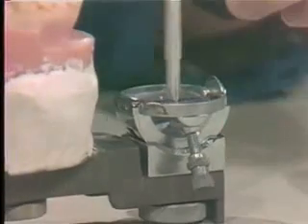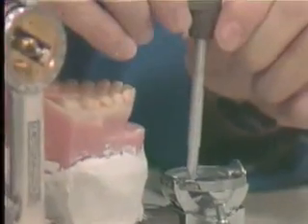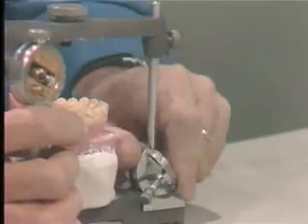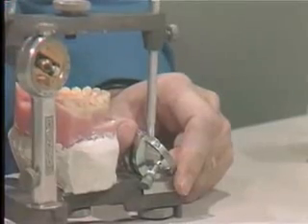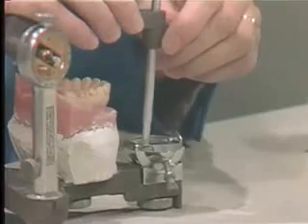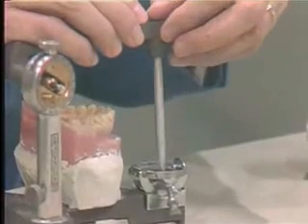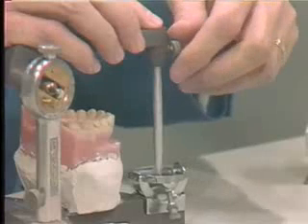Okay, now if you miss it the other way and you forget to drop the pin, your pin will go in this direction, and then when you get ready to set your incisal table, you can see that you will not have any working room. You've locked yourself in. So it's necessary, when you take your centric wax bites, to estimate the thickness of the wax and drop the pin that thickness, so that when you do remove the bite and the teeth come back in contact, your pin will still be centered.